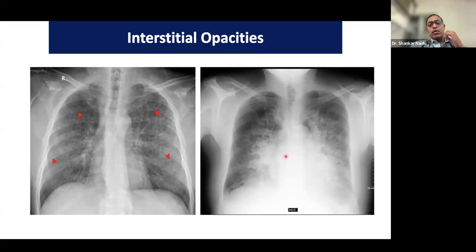So this is a classical example of pulmonary edema, which we call the bat wing appearance. So these are like two wings of a bat spreading on both sides of the chest. This is very characteristic of conditions like pulmonary edema, or sometimes alveolar hemorrhage can also have this kind of distribution. So radiologically, we will not be able to differentiate between pulmonary edema versus alveolar hemorrhage. Depending on the given clinical context, we can differentiate between these two. Radiologically, both of them might appear very similar.